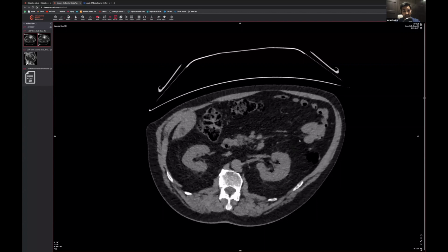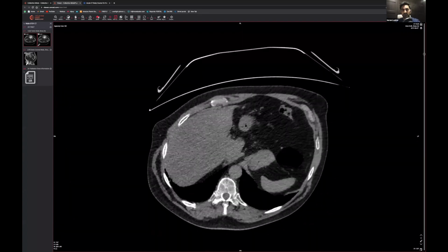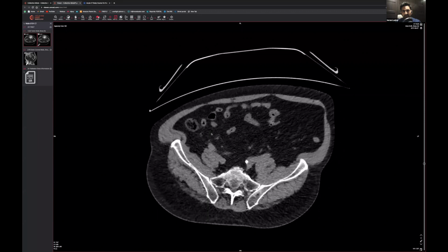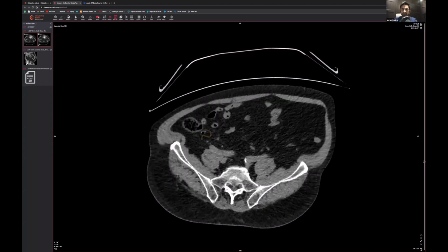Then we're coming to the splenic flexure, coming along that way, going this way, across the transverse colon, going down this way to the ascending colon. And can you see the appendix just sitting there, a little tiny tubular thing going this way? Let's just try and draw that out. It goes like this and goes like this. Yeah, so that's all good so far.